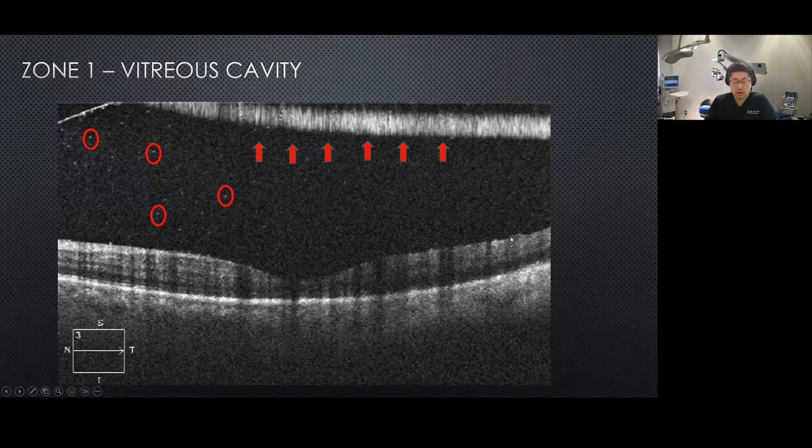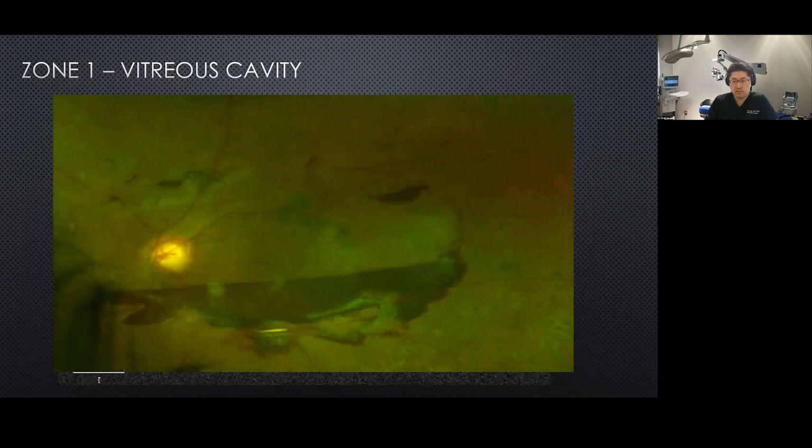So you know these are not artifacts, and they are truly present, not far off from the surface of the macula. One of the questions that we commonly ask is, if you see the posterior hyaloid, say, within the scan of your OCT image, will you call this a PVD? Of course, the answer is no, because PVD is defined by the liftoff of your Weiss ring.